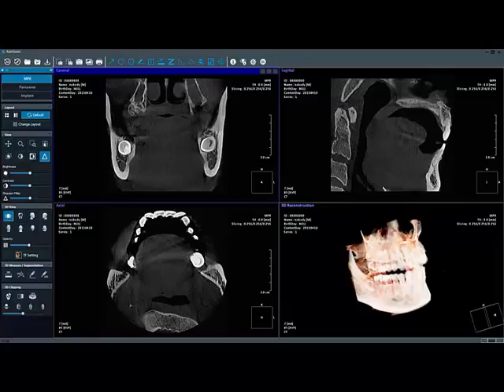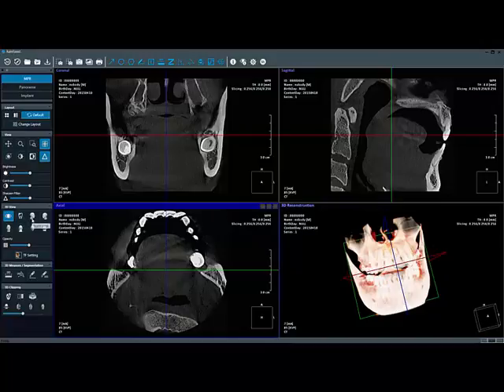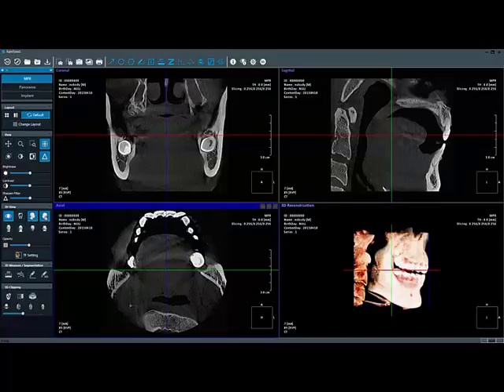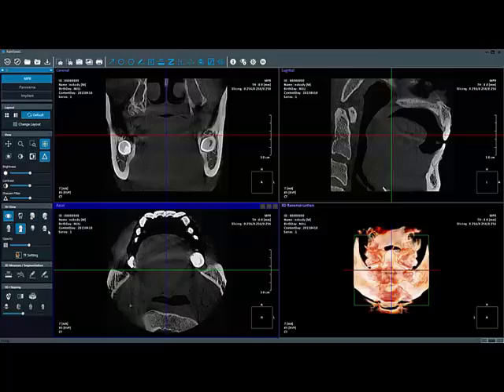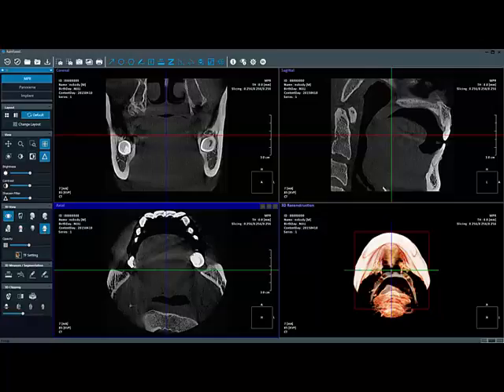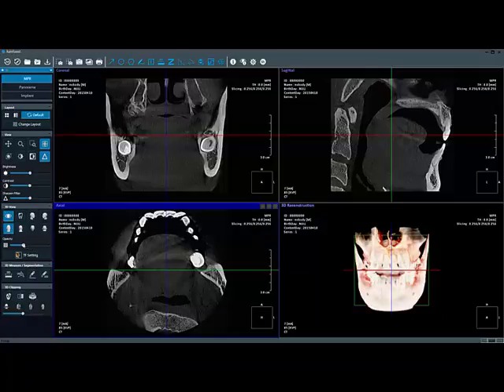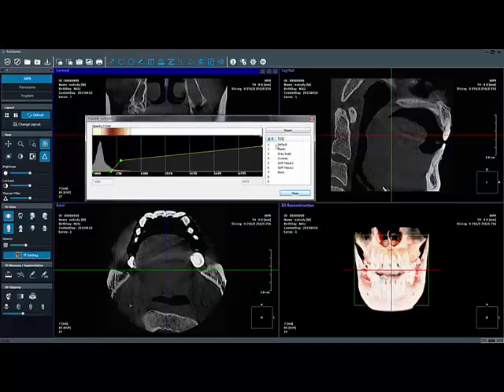You are able to select an aspect of the 3D image: right, left, front, back, top, and bottom. You can adjust the opacity and define TF setting, the transfer function, also known as fine-tuning. TF setting is set default with several different settings, so it can be applied quickly.